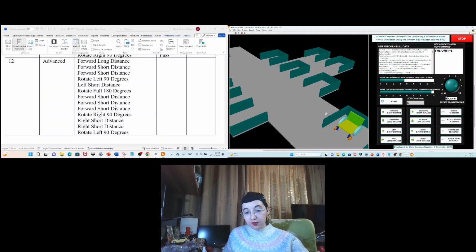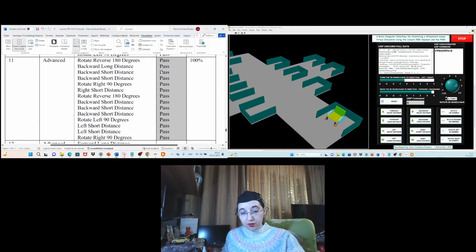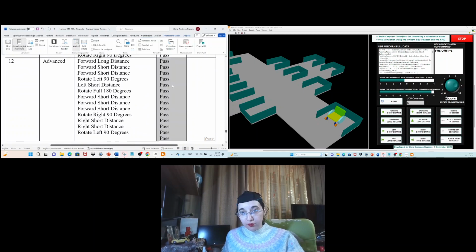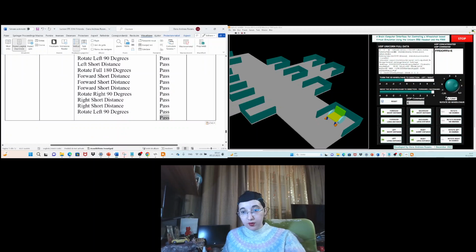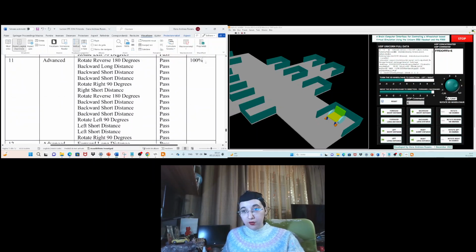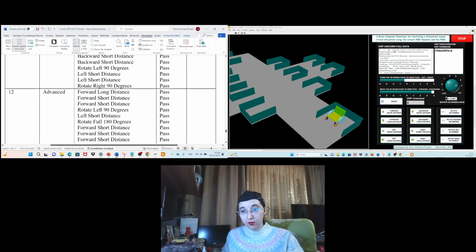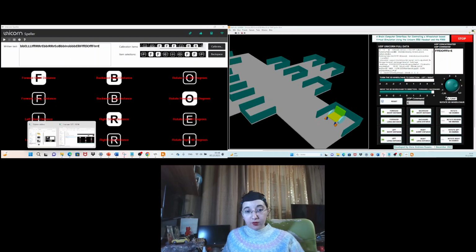Okay, so everything is perfect. The commands were correctly executed, but there was some confusion. Yes, it was some technical issue between LabVIEW and Unicorn. So I can check this.